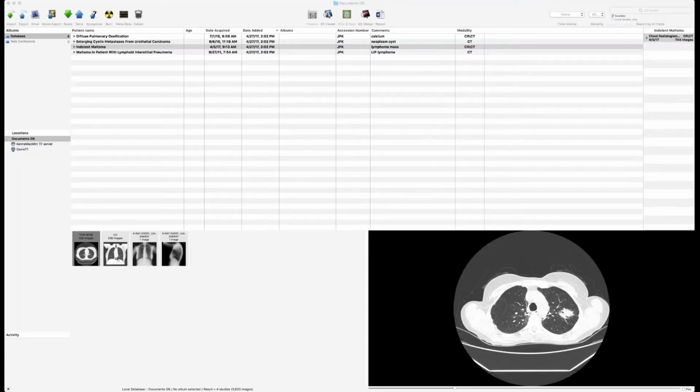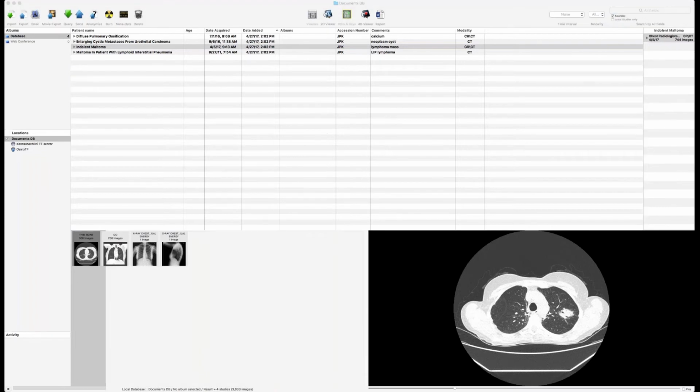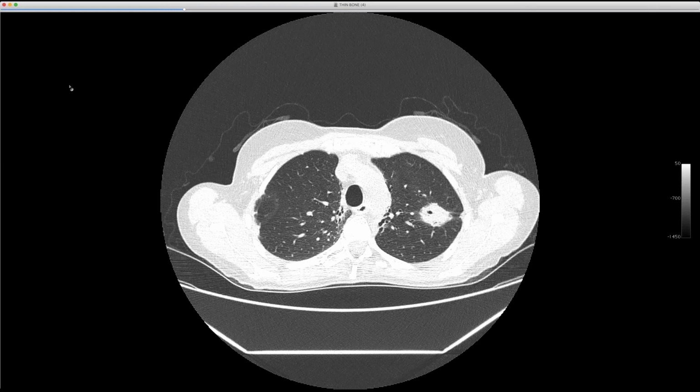Well, let me show my lymphoma case here. All right. So I have two MALT lymphomas I was going to show. And hopefully in a second you should see, you guys see a CT scan? Yes. Good. So this patient had a history of a treated Hodgkin a long time ago. Jeff, we can see your database screen rather than your 2D viewer screen. That's amazing because I can't see my database screen. Now you should be able to see it.